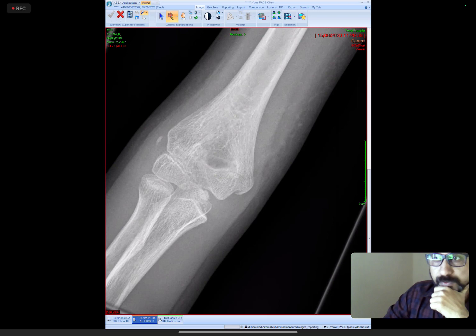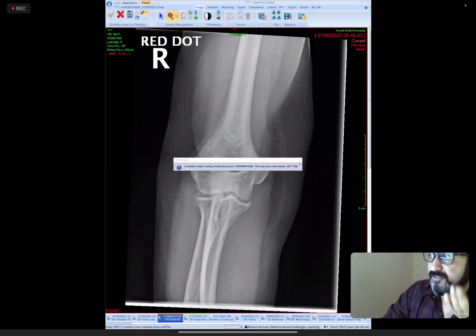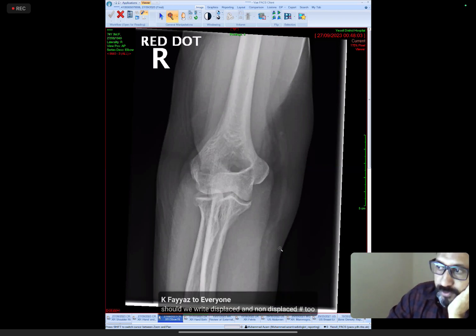And now, fortunately, I'm not sure, fortunately or unfortunately, but I have given you this image. This case, I would have given you only the AP view, but I thought it's fair.